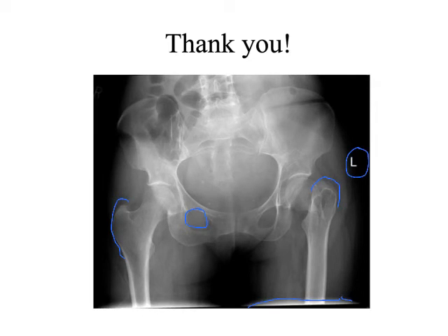Okay, bear with me here. If you've got something that's supposed to look like that on an image, right? Greater trochanter. And all of a sudden it looks like that. What might have happened? They're rotated to the right, but isn't that why? Because their feet are pointed inward, but they're rotated to the right, so it's not in full profile. No, but let's think about that. That's a good point. I like the way she's thinking.